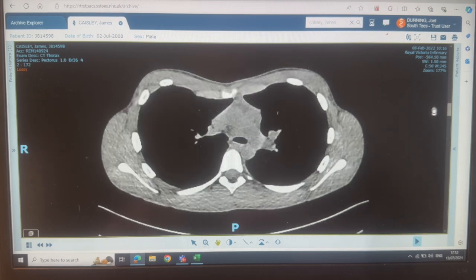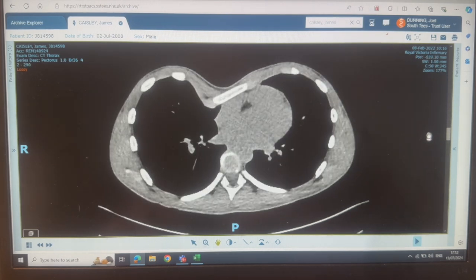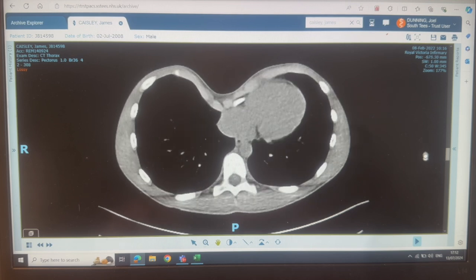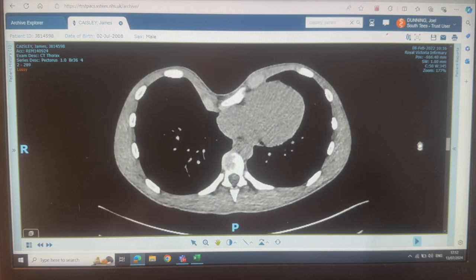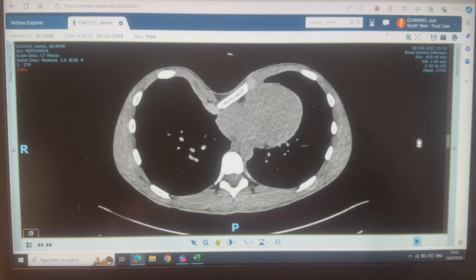So I'm going to go down. I'm looking for the deepest point of dip. So here it comes, getting pretty deep. This is an NHS England accepted patient. Just having a look, and I think that's probably about the deepest point there. So, I'm looking here. It doesn't matter where the deepest point is, as long as it's the deepest point.